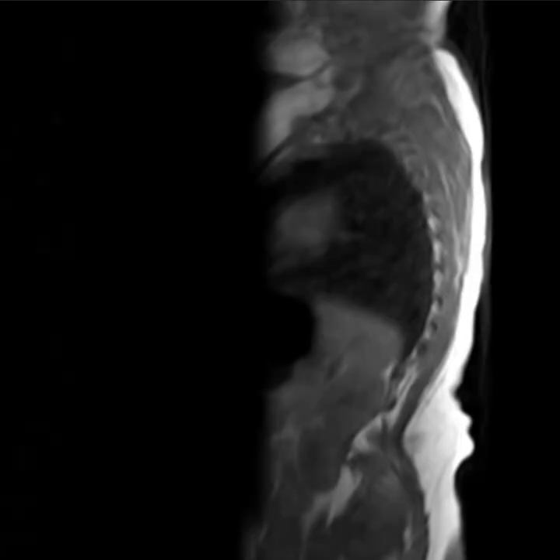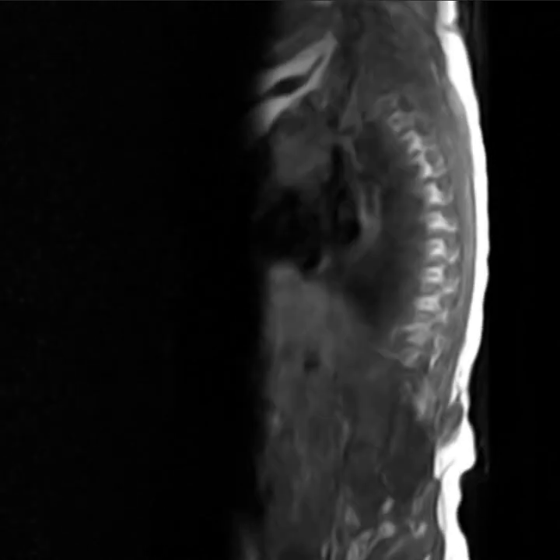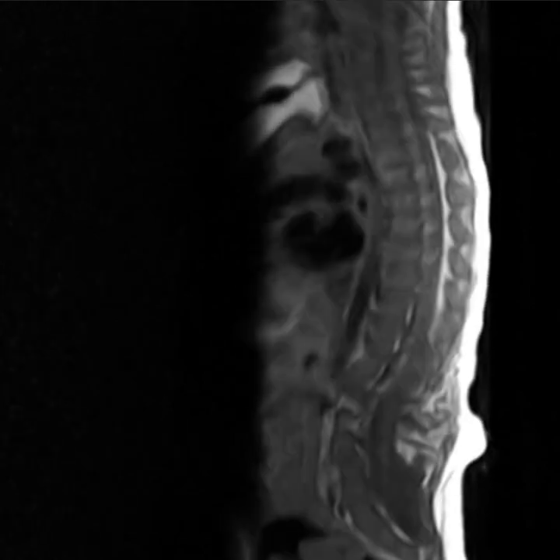These are the T1 weighted images, and here we can see again there is some sort of vertebral anomaly at this level, and we can see the spinal cord tethered here. I want to see the sagittal myelogram. Okay, so this is the sagittal myelogram. Again, there is some sort of dural ectasia around the lower lumbar and sacral levels.